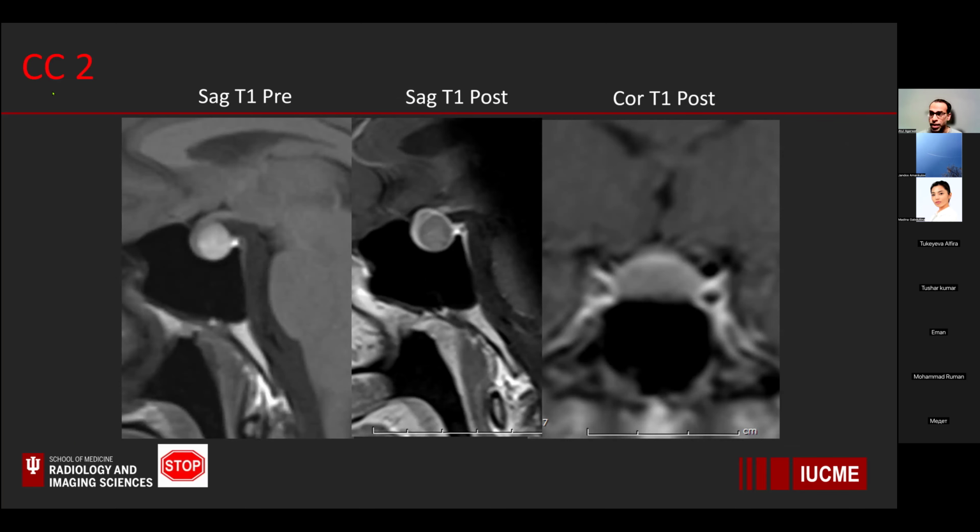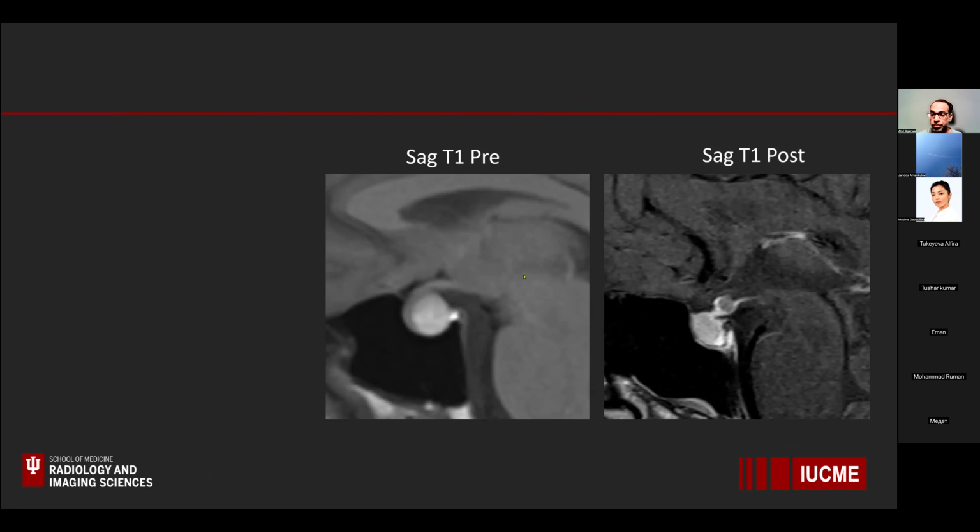This is yet another companion case, so a different case. And in this case, the lesion itself is very bright. It's bright on T1. Once we give contrast, the contrast is brighter than the T1 hyperintensity, and you can see that here, that same claw-like enhancement around the lesion, again appreciated on the coronal post-contrast sequence.